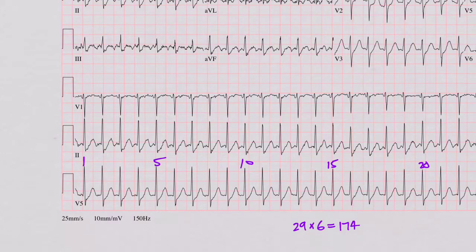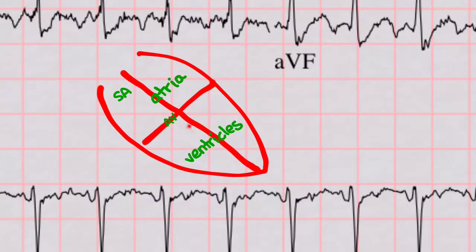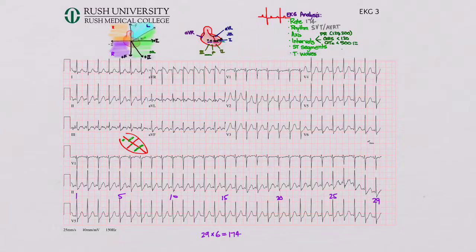that usually tends to be an AV nodal reentrant tachycardia, or what we used to call PSVT, or paroxysmal supraventricular tachycardia, which tends to start here in the AV nodes, going around and around and around and shooting the signals down through. And so I call it SVT, but it's really probably better called AV nodal reentrant tachycardia, because technically AFib is a supraventricular tachycardia. So that's what I think is going on here, because it is going very fast.